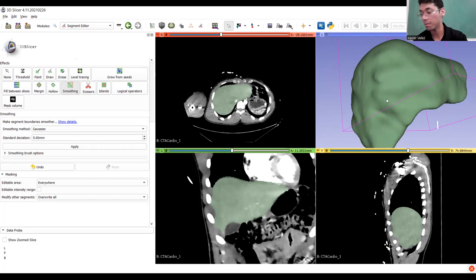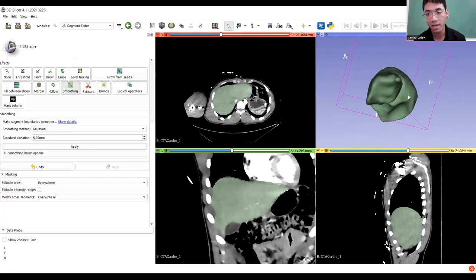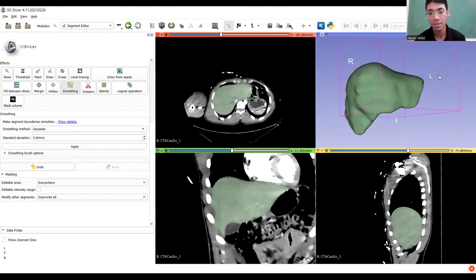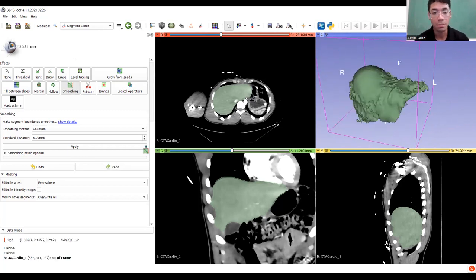Just making sure there were no comments or chat things. So okay, again, looks a little better. Because we're trying to make this a little prettier, I might smooth it a little bit more, just because it's still a little ugly, but this looks a lot better than how it started. So I might bump this up to just like 6.5, and we'll see if that is good enough. Again, all this is pretty subjective. So it kind of just depends on your application.